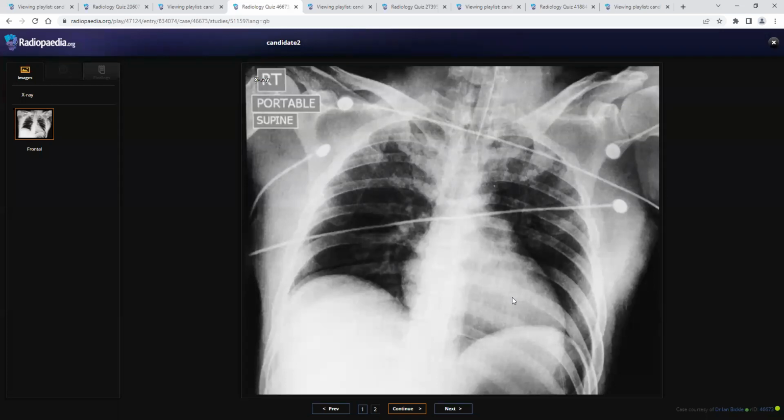Okay, so this is a supine patient, and I think there is a deep left-sided sulcus, which may suggest that there is underlying pneumothorax on the left side. The right costophrenic angle is unremarkable, but the left is slightly deeper, suggesting pneumothorax, and the bilateral upper zonal opacities may represent contusions. Can you see any other fractures? What do you do next?